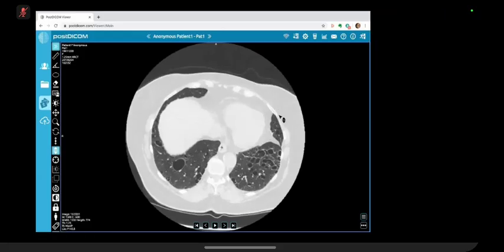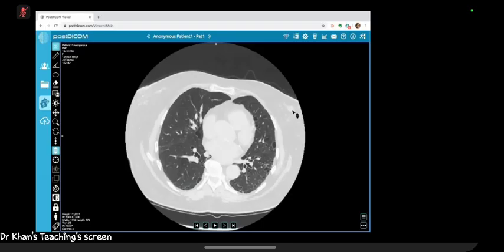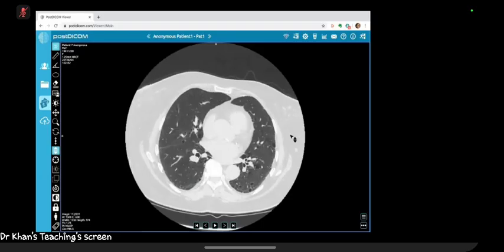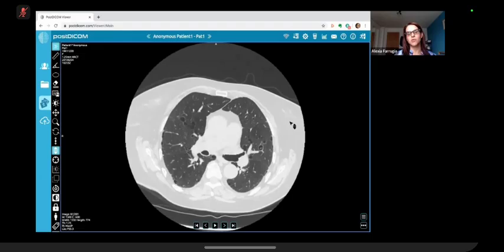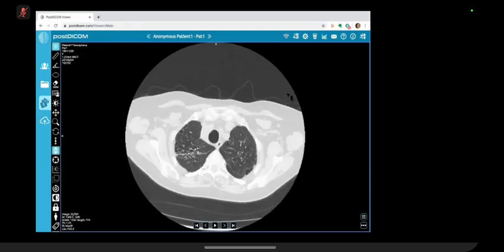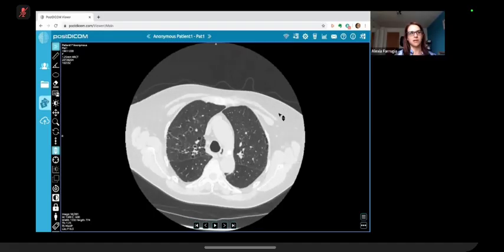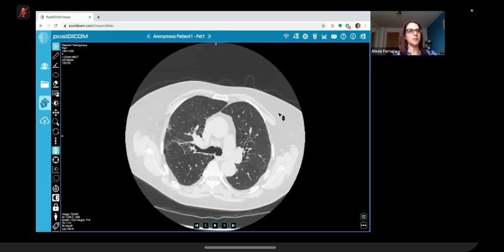I was considering whether it might be LAM, but with that you'd expect there to be a chylothorax or something. And this would be more uniformly distributed, isn't it? Yes, throughout the lungs. So this lady had LIP, lymphocytic interstitial pneumonia. Right. Which we do see in Sjogren's syndrome.